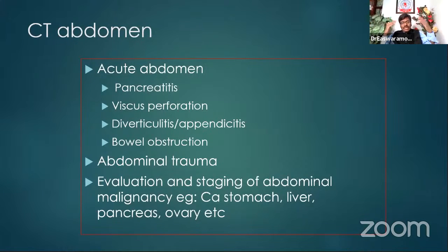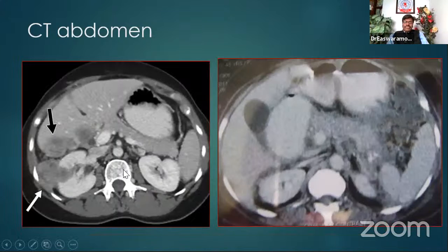Those adages or descriptions are from before the era of imaging, like 20 years ago. Now, when we go in, 99.9% we go with the diagnosis, because the patient likes to know the diagnosis before we open the abdomen. Days are gone where we say laparotomy and proceed. Now we consent: here is a case of small bowel perforation for laparotomy and suturing. Like that only we make a clear-cut diagnosis before we go for surgery. For that, all this investigation helps. Like here, right kidney, left kidney, I told you.